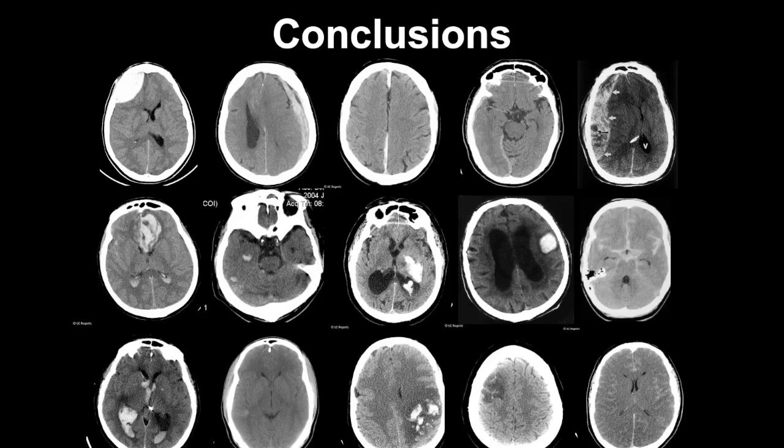So that was the conclusion of our tour of intracranial hemorrhages. So again, the clinical history, the age of the patient, but also the distribution, the appearance, and the pattern of intracranial hemorrhage on the head CT can help you diagnose what type of hemorrhage you are dealing with, can also help you recommend next steps. And remember the ones that are frequent, like head trauma, arterial hypertension, amyloid angiopathy, all the vascular malformations of the brain, but also remember the least frequent ones, like the venous infarct. And remember that sometimes there are mimics like the pseudo subarachnoid pattern.